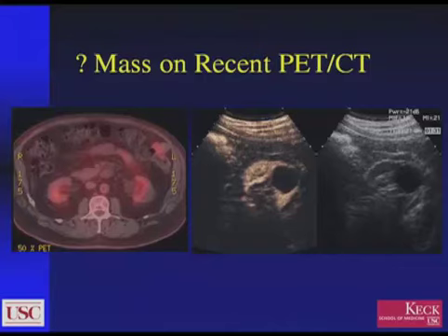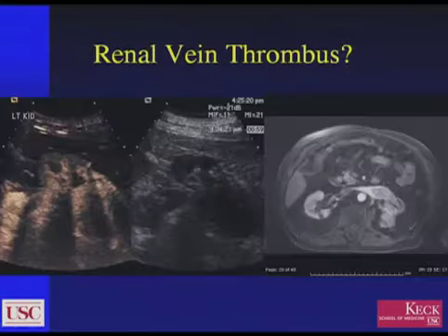Another simple thing that we do here is a patient with a history of malignancy with a PET CT, an area of low density here with no enhancement following the injection of the fluoro-FDG, and clearly this turned out to be a simple cyst on contrast ultrasound.